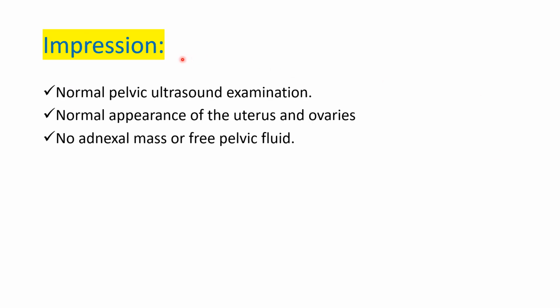So the impression is the last thing that you are supposed to give in your report. Normal pelvic ultrasound examination, normal appearance of the uterus and the ovaries, no adnexal mass or free pelvic fluid. So this is enough for your pelvic ultrasound scan. It shows the referring clinician that you've assessed and checked all the essential organs and regions of the pelvis.